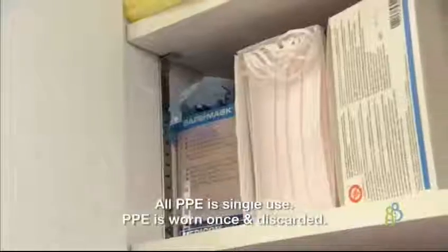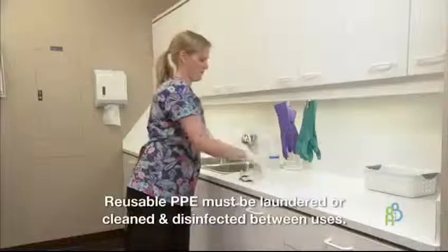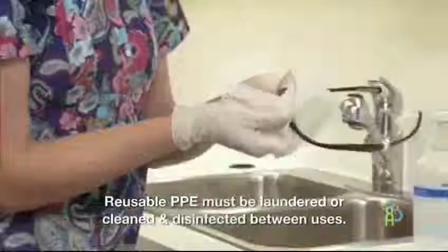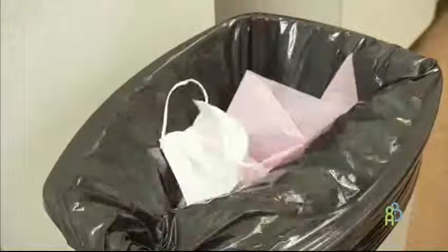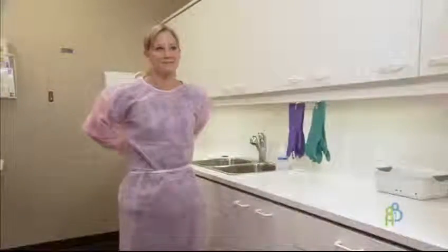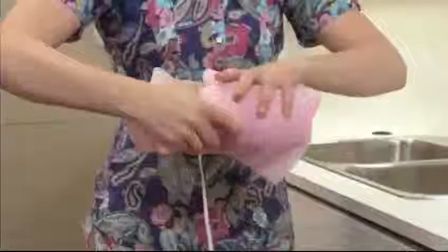All PPE, including masks, are single use. Any reusable personal protective equipment must be laundered or cleaned and disinfected between uses. This means there must be a collection or disposal container for used PPE where it is removed. PPE must be appropriate for the tasks it'll be used for. PPE used in reprocessing has specific requirements that must be considered when being selected. For instance, gowns should be moisture impervious, cover the arms, and fasten at the back. They must be either discarded if disposable or laundered if reusable after each use.